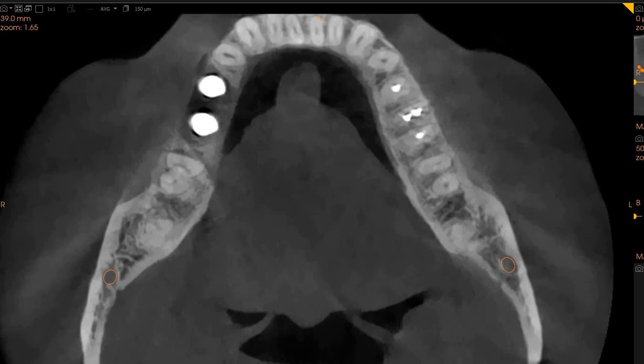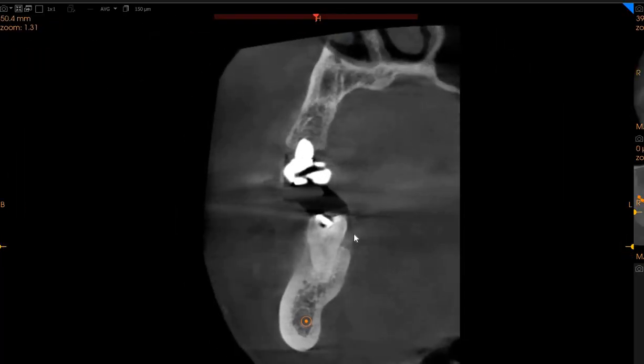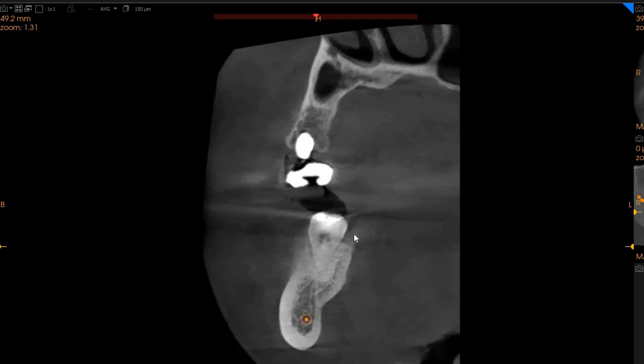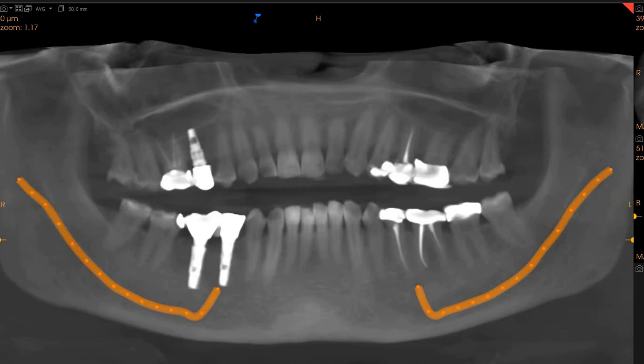transaxial view, and nothing very significant can be seen here. There you go. Very slight bit of a line on the mesial aspect can be seen, but we can't be very certain. Clinical correlation is needed right here on the lower right 7. Apart from that, the lower right 8 does not show any signs.